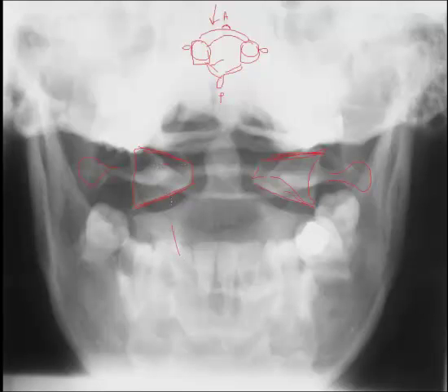And the anterior and posterior arches are also seen. Now this is not the optimal projection to see the anterior and posterior arch, however you do see the shadow of them. One of the dilemmas to AP open mouth projections is that the superimposition of the anterior or posterior arch on the dens can actually create this lucency, which we call a Mach band effect, and can simulate a fracture of the odontoid process. The tongue can do a similar phenomenon, so just be careful when you're looking at the densities in this region.